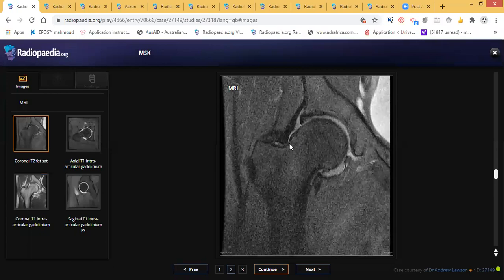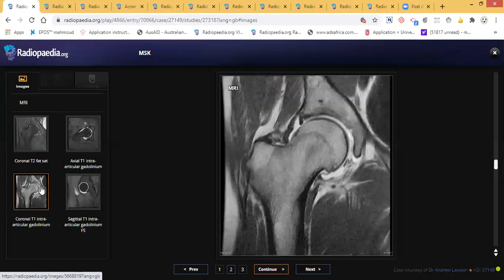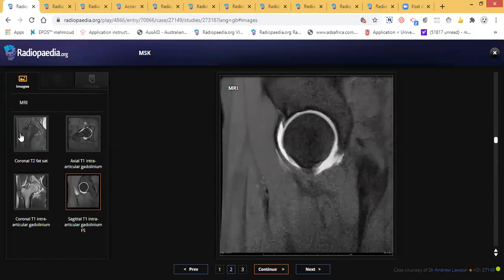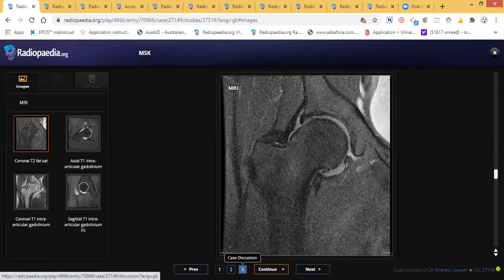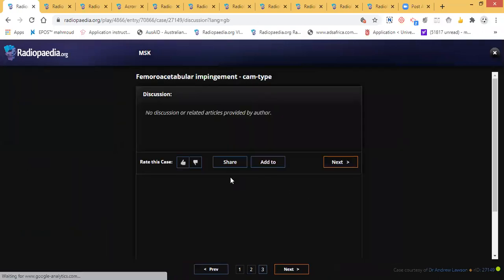The femoroacetabular impingement with this appearance is very tricky because many of us consider it normal. You will check it in the coronal, especially since on the X-ray it is more difficult. So this is femoroacetabular impingement.